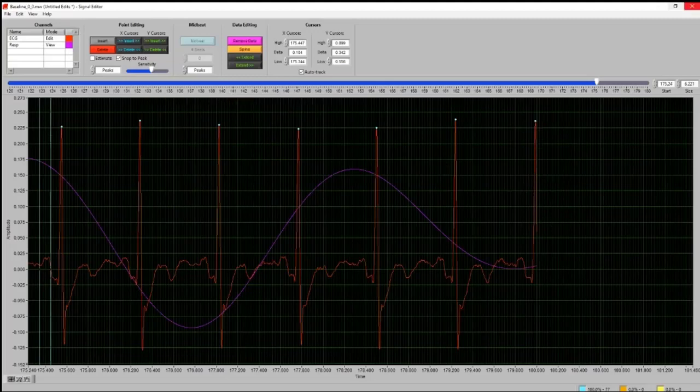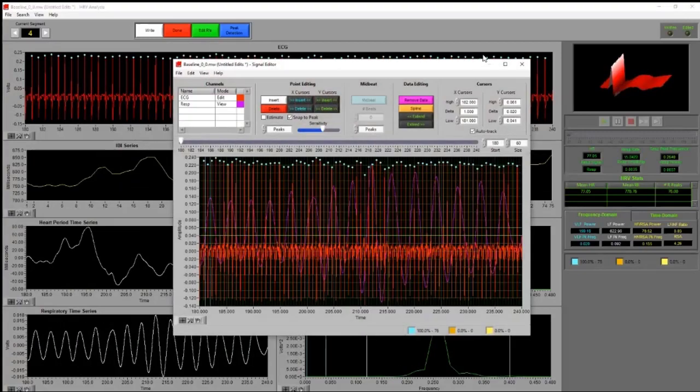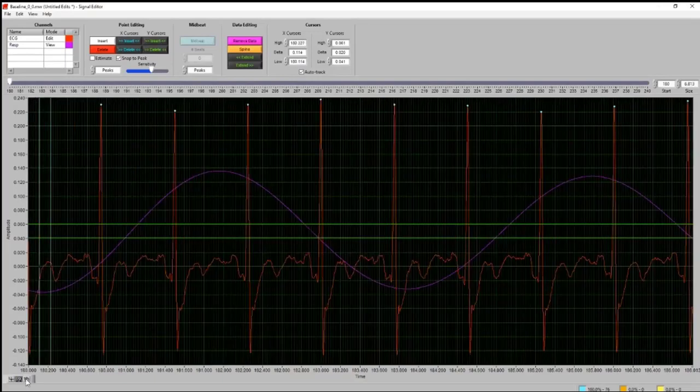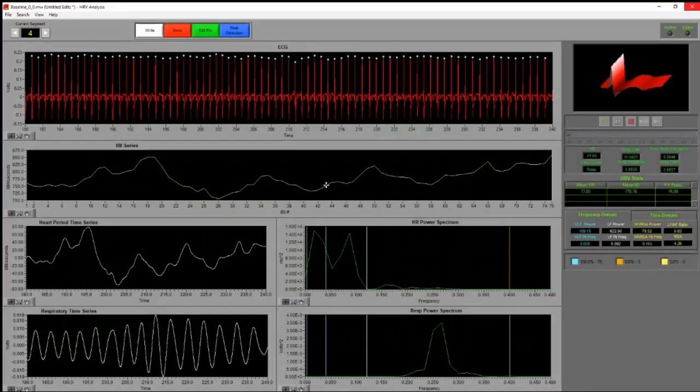So as long as I first check on segment 4 to ensure that everything looks good on that side, we can go ahead and retain it. So here's that signal coming back down, and then there's our S point, and then again, we have a good T wave. And so that would have been a good edit. Again, probably not influencing the statistics in a manner that we would really care about, but if that happens frequently, you can certainly do that.